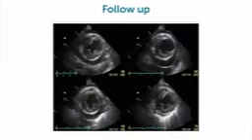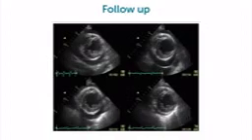One last tip when it comes to quantifying pericardial effusions. I showed you that it's possible to measure, but it's probably better if you compare the patient from one exam to the next. This is an example of such a patient where you nicely see the regression of the pericardial effusion. If you always take exactly the same loop and put them on one screen, you will see that the pericardial effusion was probably moderate here. Then it got a little bit larger, smaller again, and then at the end, it's almost gone.